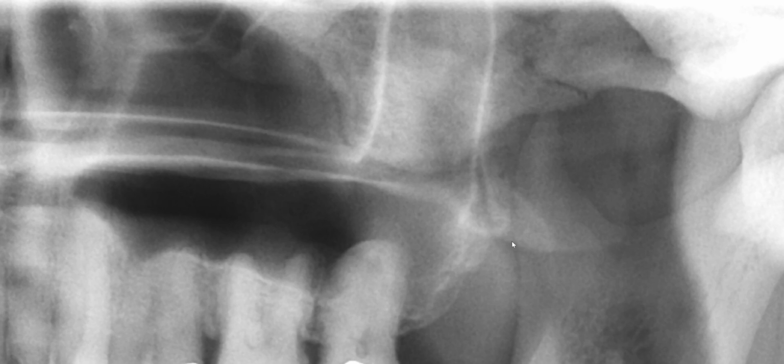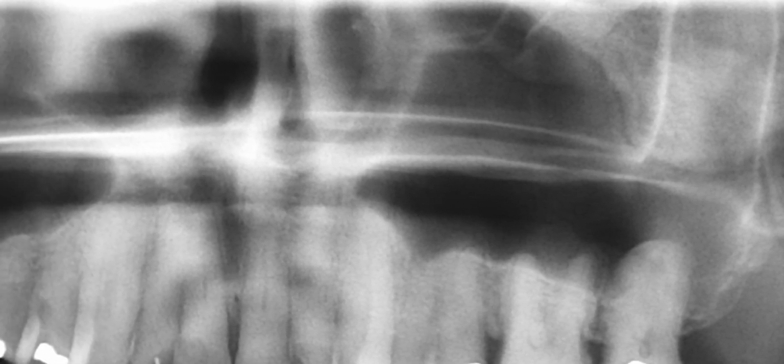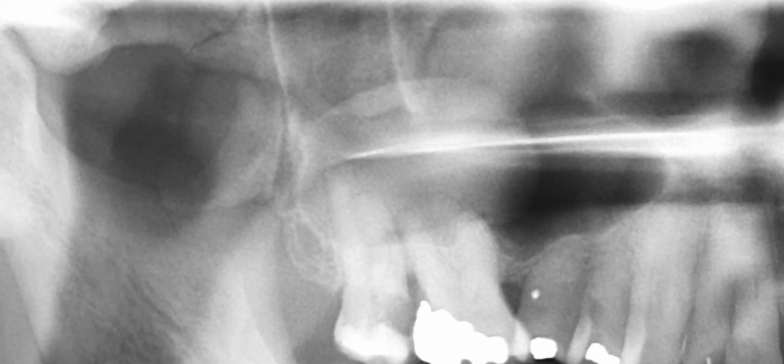So now you have to answer what this radiopaque entity is. Again, are you going to be considering fracture involving the left coronoid process, or could this be something else? I could have made this into a quiz question, but given the complexity and difficulty of this question, since I really haven't gone over this before, I'm just going to tell you what this is.